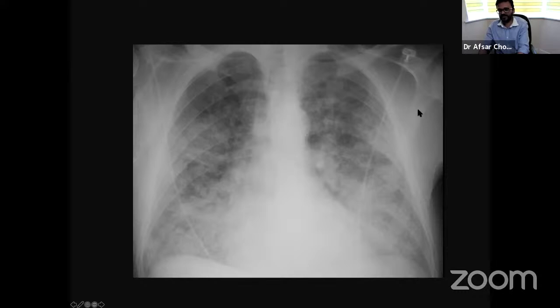The main thing is, pulmonary edema is just fluid coming out. So the patient's symptoms and the X-ray correlate well. When the patient is symptomatic, the X-ray will show signs, will show the opacities, will show all the changes. And when the patient improves, the X-ray also follows that.